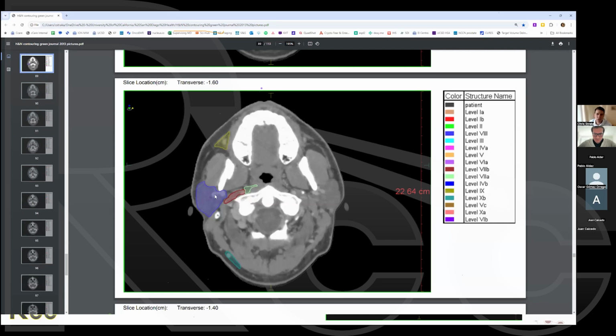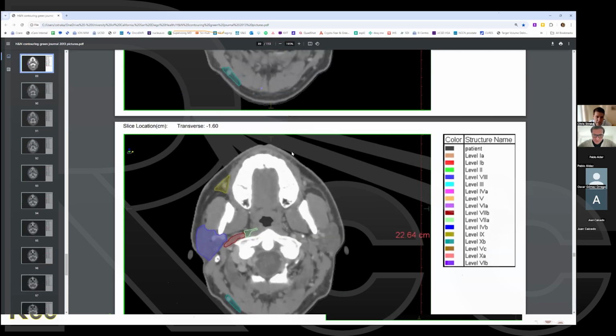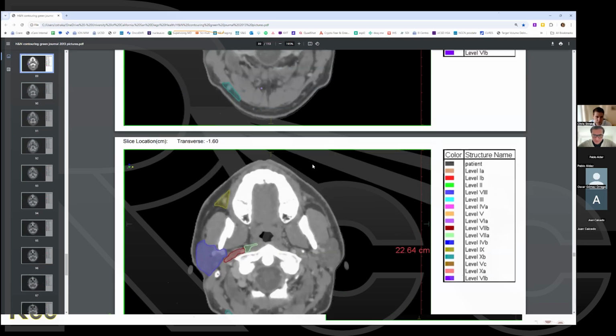And so then your dosimetrist and your planning software are fighting. The dosimetrist is trying really hard to spare the parotid, but you're also asking the planning software to cover that area of the parotid, and you're going to get much worse parotid dosimetry, or you're just going to accept a lower PTV coverage. Whereas if you're very careful about making sure these two volumes don't overlap, which is appropriate, they never should. There's no reason for elective nodal coverage to overlap with the parotid gland for non-salivary cancers. I found that helps my dosimetry out a lot, and I get better plans.